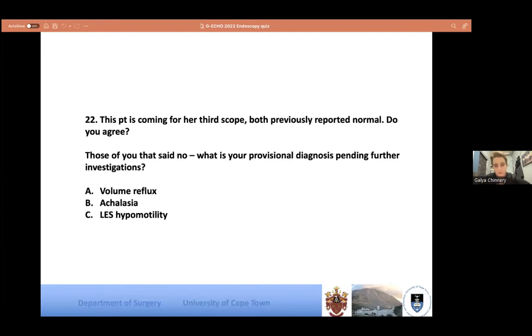I mean, this is an achalasia until proven otherwise. Good. Thank you. I think that is it. Great. Thank you so much.